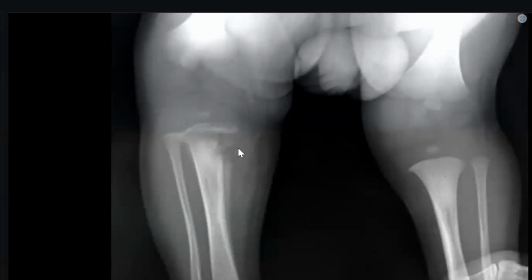Doctor, one second. Do you think this is just lucency? There is irregularity and lucency, something more dangerous. Yes, continue, along with periosteal thickening. Excellent.